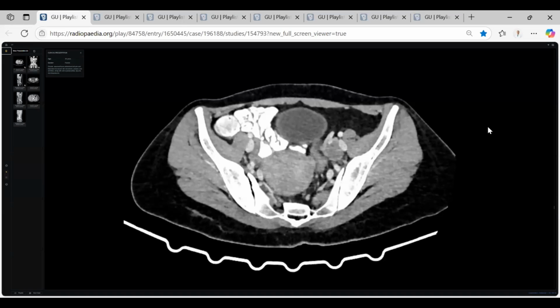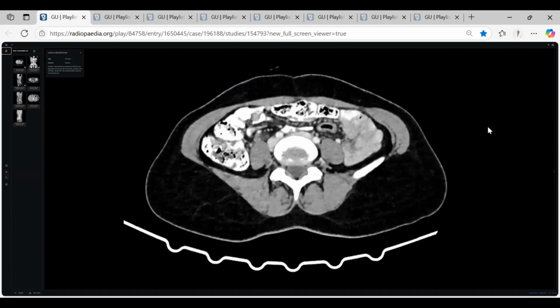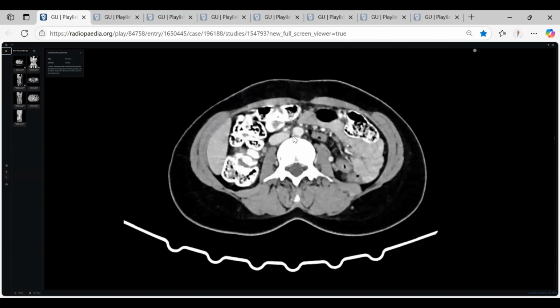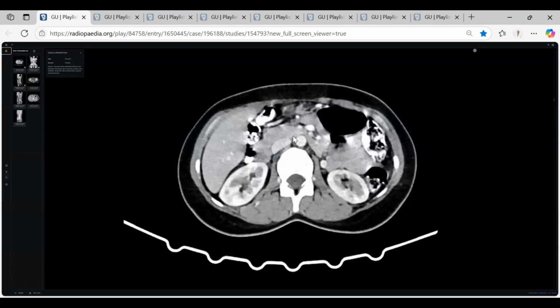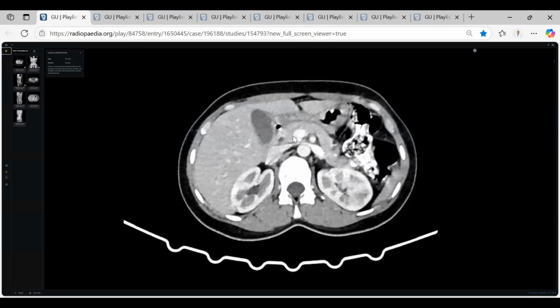My advice for you: try to trace the cause of this congestion. Okay, sir. As I move further upwards, I'm trying to look in the region. The ureters are normally traced. This is the IVC, inferior to the kidney. Look here, stop. What happened here?